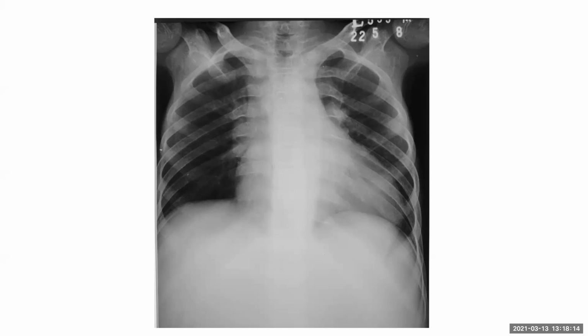And I'm looking at the cardiomediastinal contour. This is not an ideal position to measure the CTR, the cardiothoracic ratio, but I think the heart appears a bit enlarged. And I'm looking at the costophrenic angles. The left costophrenic angle is normal, and the right costophrenic angle is also, I think, normal. And I'm looking at the bones, the hila and the ribs.